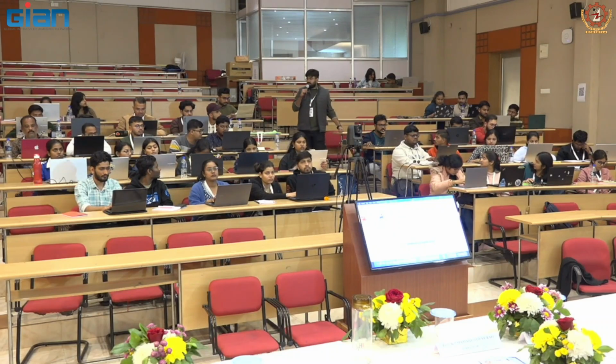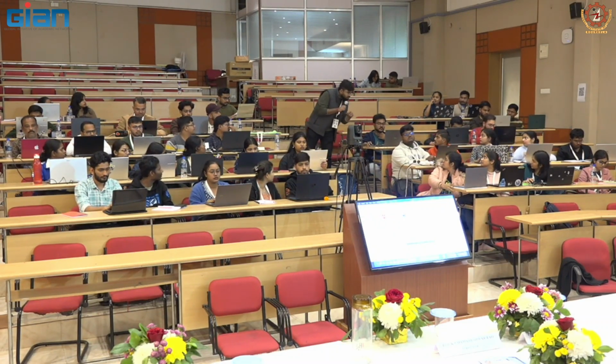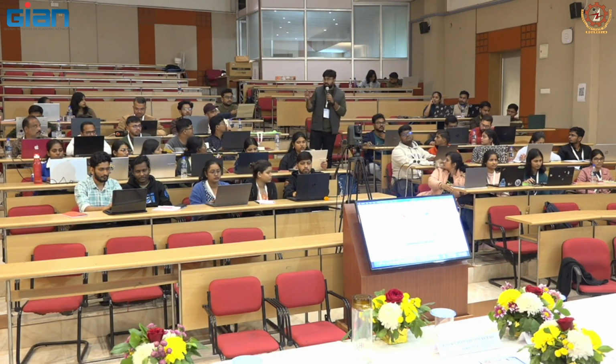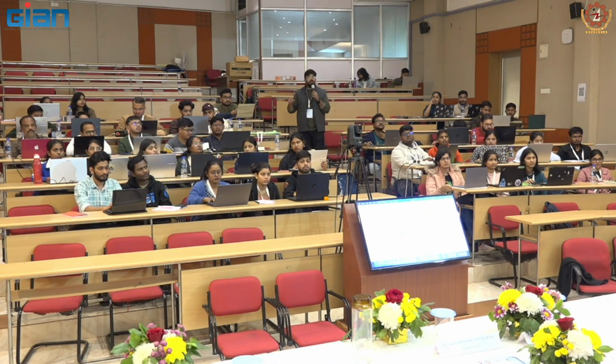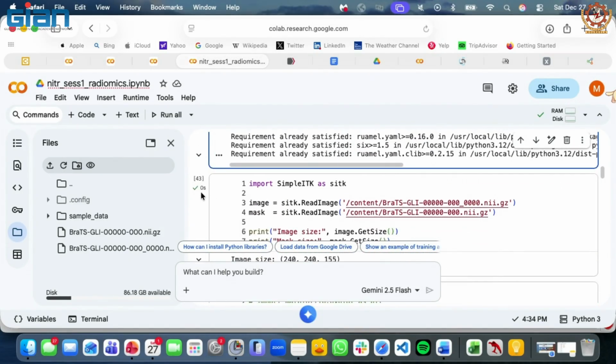Sorry. I think you guys are also facing some problem, right? Something not imported. There is a package or library called Radiomics that you actually have to install first. So just type pip install and the module name. Are you guys able to install this? Some of you are facing the same problem.